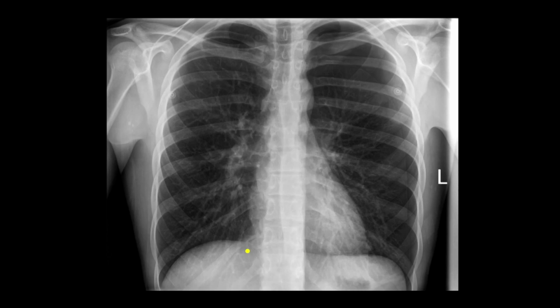So here is our first example. Starting around the periphery of the lung, looking around the lung margin, what suddenly catches my eye is I can see an extra edge here. I'm just going to trace it out and then we can get rid of that and show you. So we can see a lung edge here, and beyond the lung margin, you can see that there are no lung markings. So this is a fairly sizable pneumothorax.